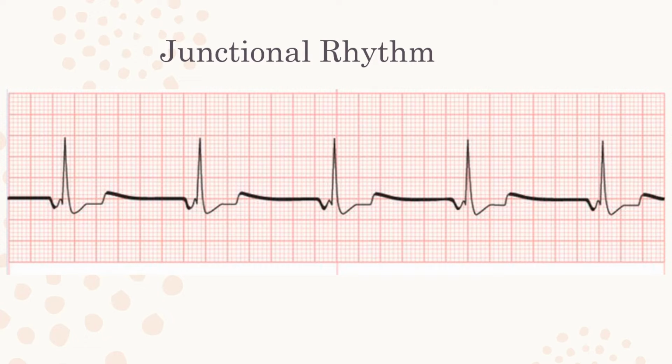Here's a great example. If you look at this particular rhythm, you can see the inverted P wave before each QRS.